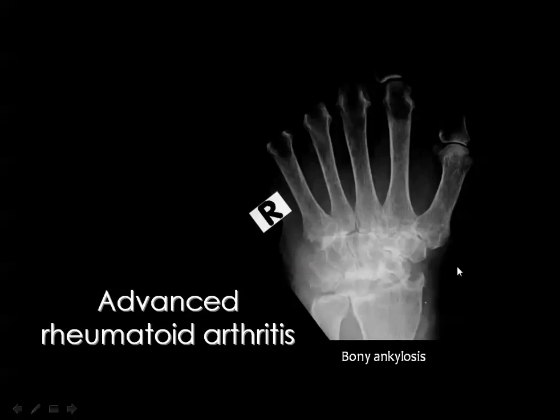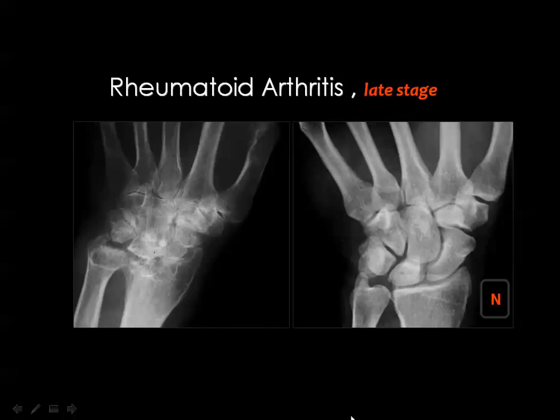A case of bony ankylosis secondary to advanced rheumatoid arthritis affecting the wrist joint with obliteration of most of the intercarpal joints, marked narrowing of the radiocarpal joint. And these are also later changes of rheumatoid arthritis compared to the normal appearance of the wrist joint.